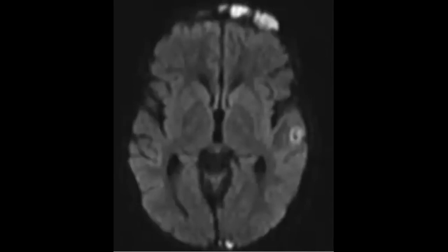That's why it's important to comment if there is any hemorrhage in the T1 or in the SWI sequence. So if you have an SWI sequence, susceptibility weighted images, or T1, search for any hemorrhage. Then this patient might need anticoagulant or thrombolysis therapy. That's why, as a radiologist, you should be careful. If there is any hemorrhage in this case, you should comment on it.